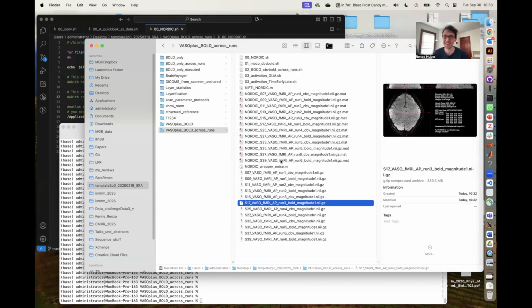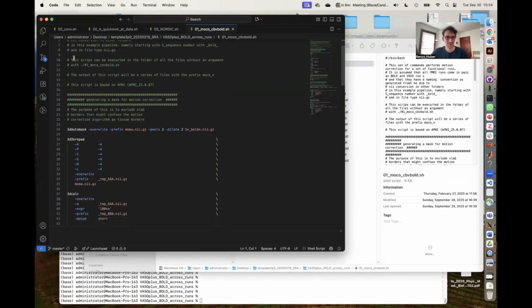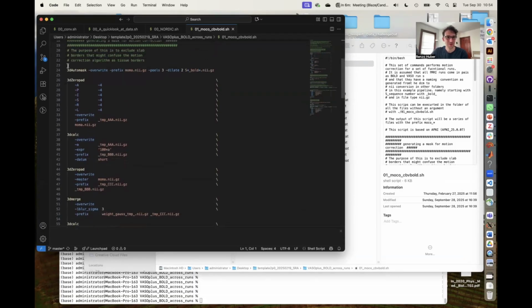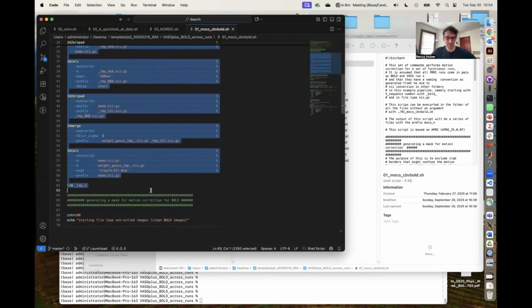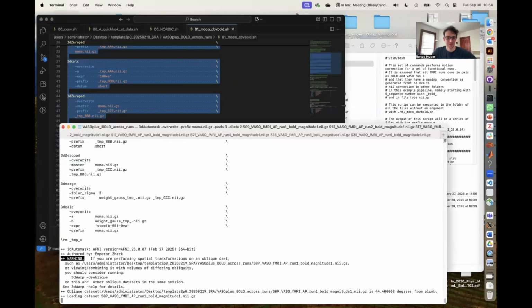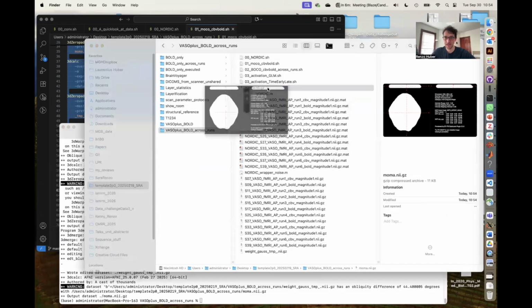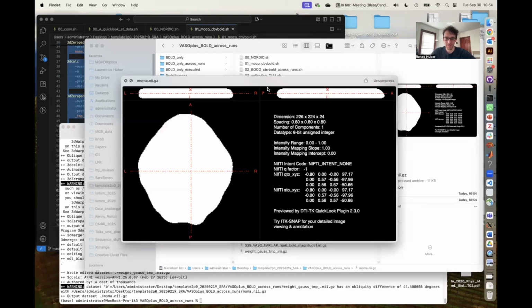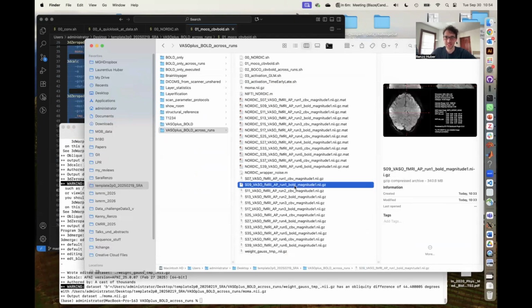So next, what we want to do is the motion correction. And the motion correction is shown over here, which we can load in there. And there is some description of how this is done and why it is done in the script as well. The first part of the motion correction is basically finding a good mask to apply the motion correction in. So I copy pasted this because I wanted to show you the in-between steps. So it is generating a little mask. And this is very helpful because for these kind of slab data that we're looking at here, very often the outermost slices are tricky and have different signal magnitude.